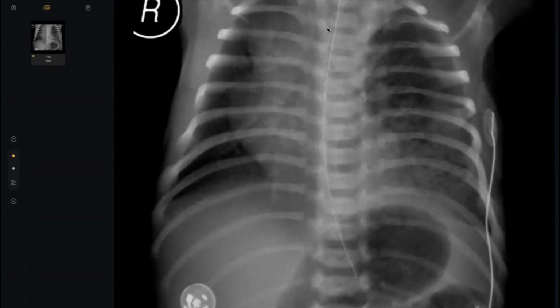See here, if you told me, doctor, it looks like shifting of the mediastinum to the left, to the right, and so the pathology is here, despite this is positional, by the way, I will accept, but you should continue. Oh, doctor, I see here there is opacity. This is very acceptable.